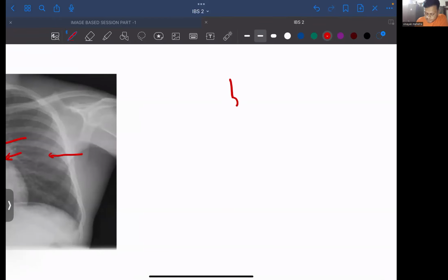First notch, or you can say first curve, second curve, third curve, and then comes a last large fourth curve. Okay, this is going to form the left border of the heart. Like this, and something comes from the down as well.